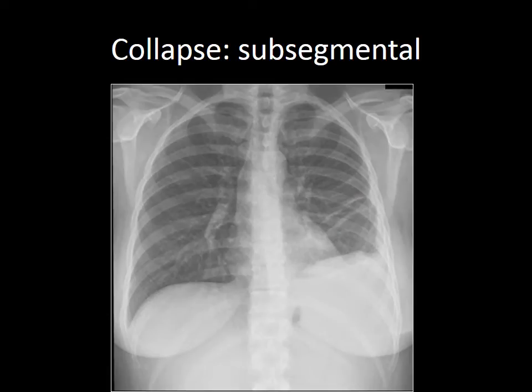Subsegmental atelectasis is a minimal degree of collapse, as seen in patients who are not taking deep breaths, such as post-operative patients or patients with rib fracture or pleuritic chest pain.